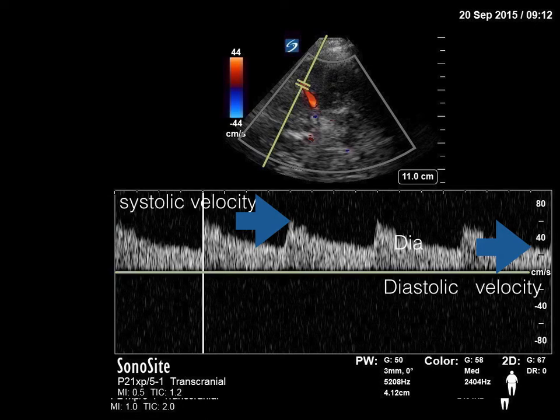All right. Now, we spoke a bit about systole. Now let's speak something about diastole. In diastole, which is around less than 40, around 35, what will happen in brain dead patients is that the diastolic flow will go down, down, down, and it will become flat. In completely brain dead diagnosis, the ancillary test or indicator is the reversal of diastolic flow. The diastolic flow, instead of being positive, will become negative.